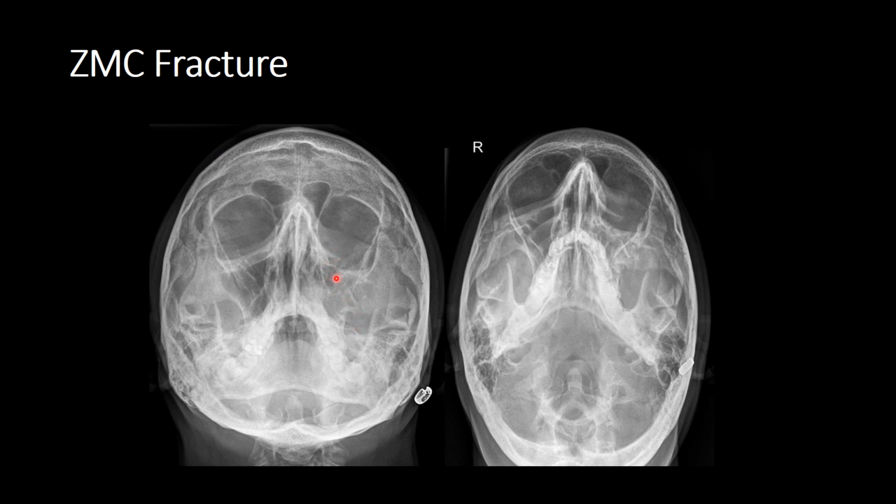So the infraorbital margin extends out to the lateral maxillary wall. Over the inferior margin, we can again see the infraorbital fracture, and the fracture to the zygomatic arch. So we've got 1 injury, 2 injury, which extends down to here. So that's 3, 4. 1, 2, 3, 4. We've got a fluid level within the maxillary sinus, unsurprisingly.